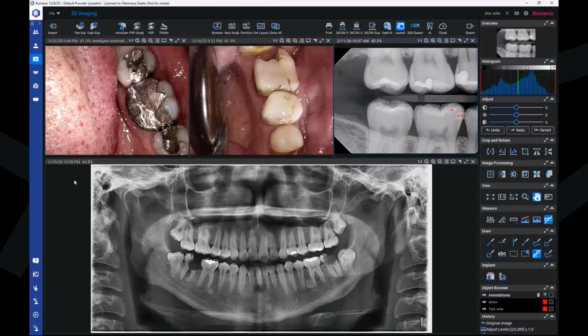And on this, I will shortly show you the studies. Of course, if you always have similar templates, similar views that you want to have for all the patients or for many of them, then it makes sense that you create these studies where you can really fix those images to the position, so that the next time you open up that patient, you can just open up that study without needing to select all the images again from the image browser, image library.